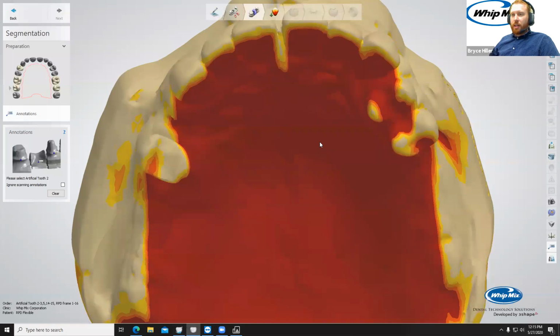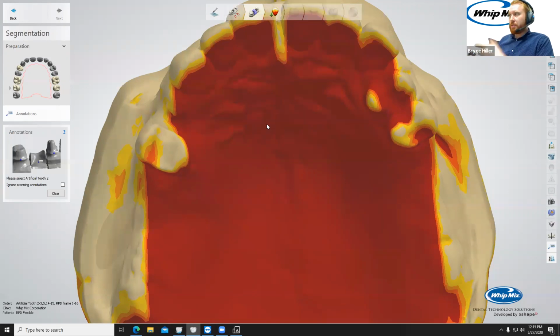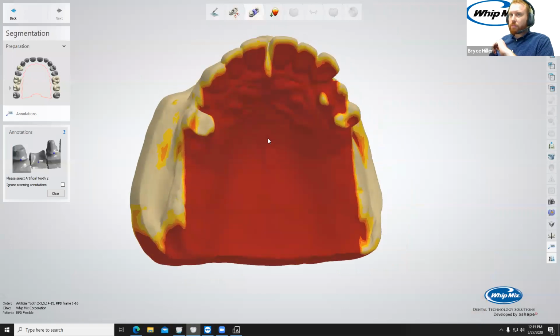I'm just kidding. But basically, the partials module is its own separate module from like crown and bridge or dentures. I kind of talked about this yesterday, but honestly, this is probably my favorite module. I just think it's super fun to use, just because it's so versatile. You can do so many different things with it, as you will see today.